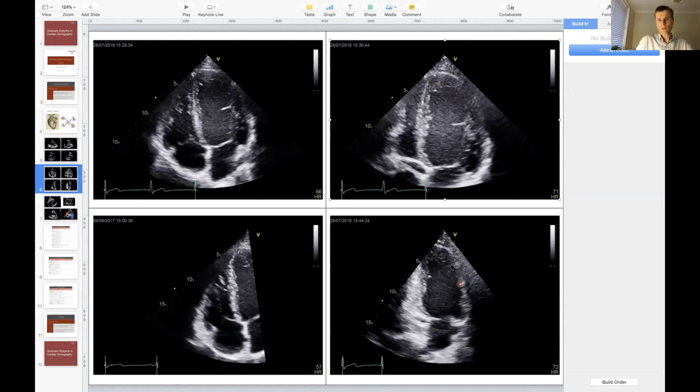In this particular slide, down the bottom here that I'm highlighting, we see the left ventricle again. Because it's a two-chamber view, we're looking at different walls. I don't want you to appreciate them all just yet. I certainly do want you to remember that there's the chamber and the walls.